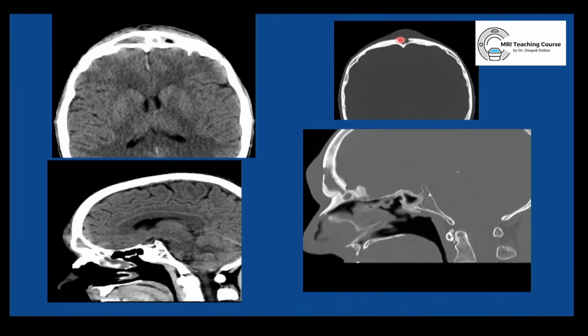As I told you, look at this sagittal image. Again, opacification and the bump here. No contrast has been given, okay? And what else are you seeing? You're seeing thickening of the bony walls of the frontal sinus. Means it's chronic. It's not acute. Whatever disease is in the paranasal sinus, I have not even said whether it's infective, inflammatory or whatever. I have not given contrast. Trust me, it is not neoplasm. And there is an erosion. So what do you think this is?